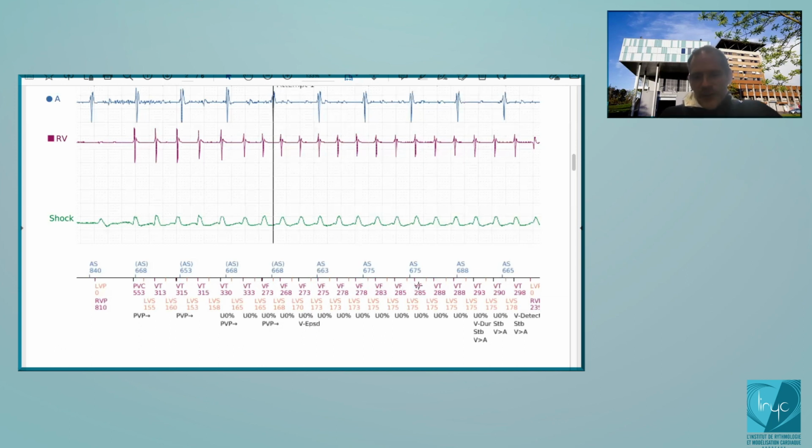But now if you have a look at the tracing, you see one cycle is VT, VT, VT, VT, VT. So 5 consecutive VT here. If there are 5 VT, you no longer have 6 out of 10 for the VF zone. That's mathematical. So on this cycle, there is no more verification of the 6 out of 10 for the VF zone.